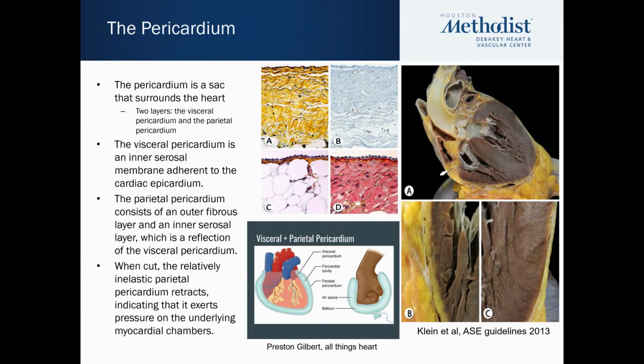And then on the surface of the heart, the epicardial surface, you have the visceral pericardium, which is essentially one layer of cells. Now, under the visceral pericardium, you could have epicardial fat, like you see here, or it can be in direct communication with myocardial cells. Very often, this is the more likely case anteriorly by the RV, whereas posteriorly, this is more likely to be the scenario you'll encounter.